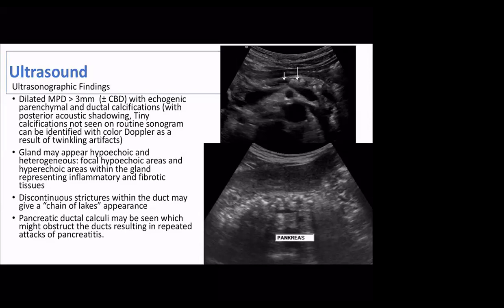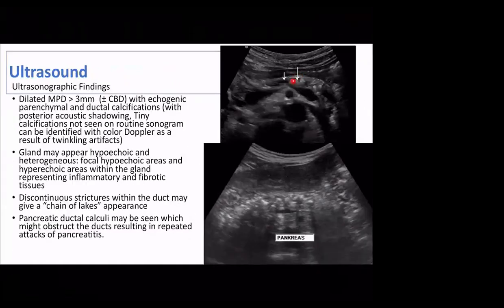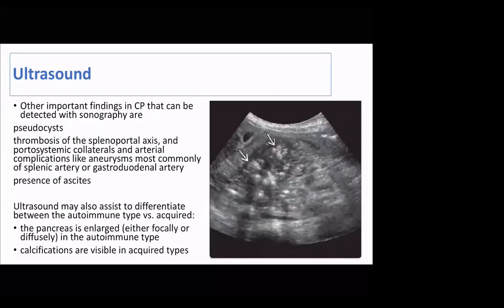مثل ما نشوف بهذه الصورة إن أكو ductal dilatation and calculi inside it with atrophy of the pancreas. هنا نشوف بالصورة الثانية إنه أكو calcifications within the parenchyma of the pancreas.